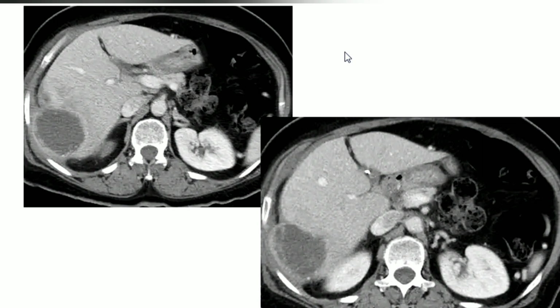Ma'am, you were asking about the hyperdense foci in the periphery of these lesions. Yes, in the dependent parts. Okay, ma'am. These can be the daughter cysts of the hydatid as well, but if there is history of fever.